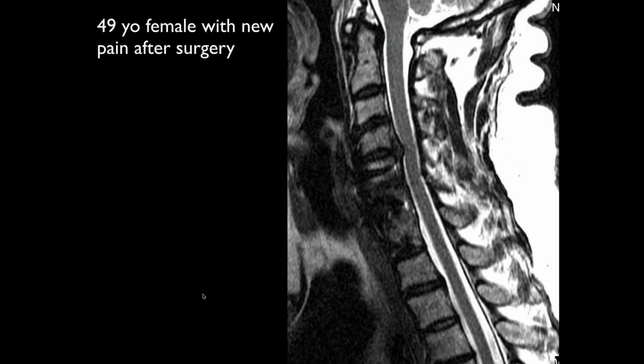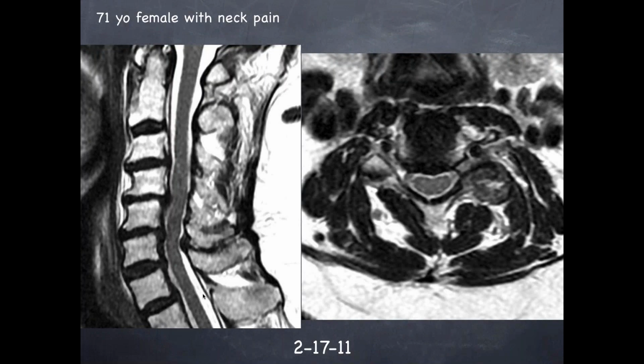Okay. I'm not sure about this case, certainly not from an MRI standpoint, and you would know better than I, the MRI wouldn't indicate surgery. Maybe clinically it would, but looking at the cord and so on, I don't know, John. This doesn't look like a surgical case to me.